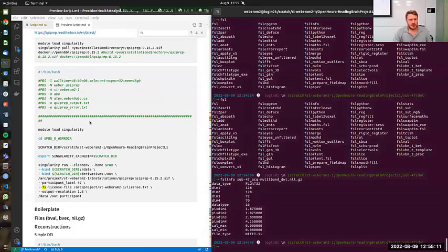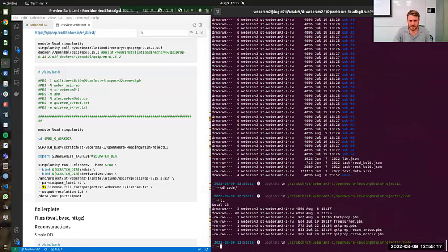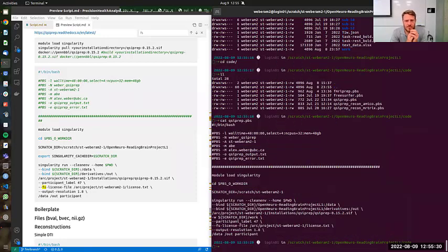Okay, so I've written that here in my code, QSIPrep PBS. So this is what I ran, and I can show you the results.